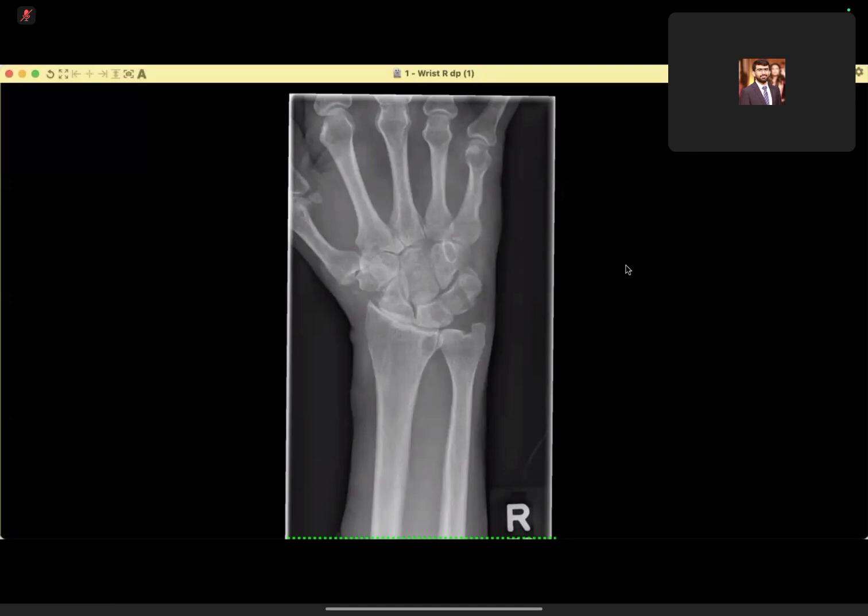So to me, it appears to be a less aggressive, benign lesion, which is in a subarticular location. My differentials for this kind of lesion can be a GCT. It can also be a bone cyst, which is less likely.